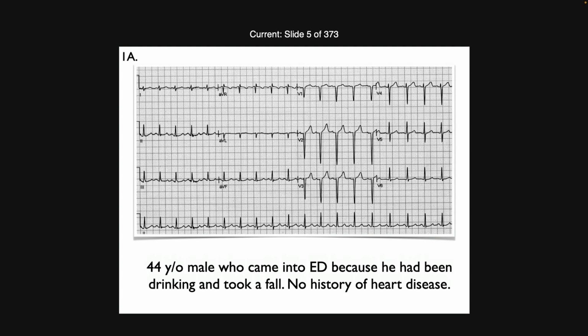So it's possible that he's, sometimes people do have heart attacks, do have MIs, and they don't know, so that's a possibility. It's a little weird though, he's only 44, he came in because of the fall, and so forth. So I wouldn't expect you to know this, but maybe you do, what's another explanation for this? Anybody know? No? No, it's something so much more simple.